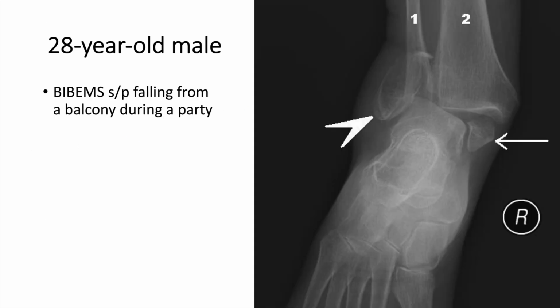Here's our next one. This is particularly high yield if you're a medical student. So 28-year-old male, and we're going to take our time with this one. So brought in by EMS, status post falling from a balcony during a party. I'll give you your time. I'll give you 10 seconds on this one. Try your best to make a read.